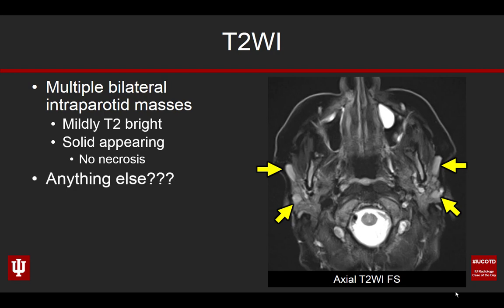Is there anything else? Do you see anything else going on in this image? I won't give the answer away just yet. Just look it over. What else do you see here?